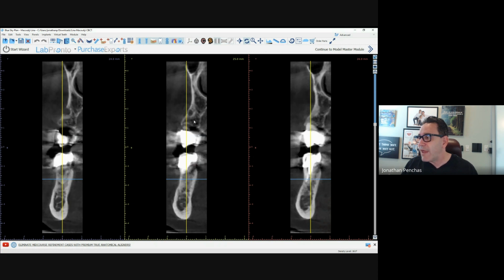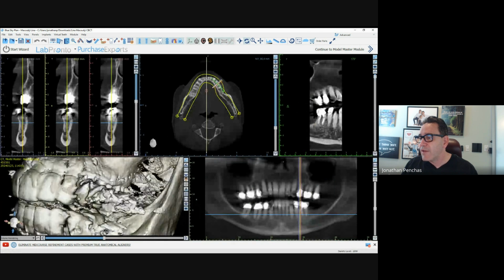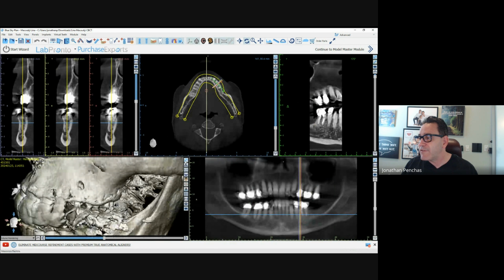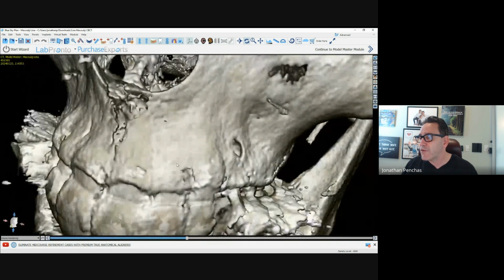And as you go around, you can see here's the abscess totally penetrating the buccal plate of the maxilla. So very easy to see because we're looking from very different areas, but it's very easy to see the pathology. By the way, very convincing for the patient when you say, look, there's a hole in your skull. You could see your infection from the tooth has ruined your skull.